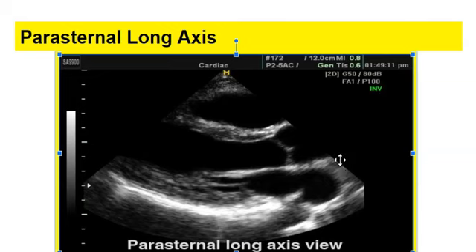So orientation is important because you can turn that transducer around and get an image. And everything you need is in that image, but it's not oriented correctly on the screen, and it could confuse somebody. And echo is really unique in this because the heart is turned around, flipped upside down, backwards, whatever you want to call it. The index marker is on the right side of the screen. If you were to do general ultrasound, the marker on the screen would be on the left side of the screen, and the index marker would have to align with that. And that's because of the orientation of the human body, left and right.